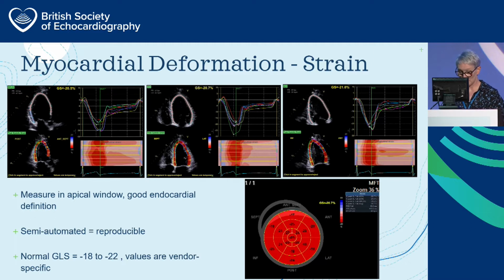So in clinical practice, we measure global longitudinal strain, and we do that using speckle tracking. So the software on our machines chooses some speckles in the myocardium and basically tracks them all the way through the cardiac cycle and determines basically the percentage change in length as they do that. We obtain our average peak global longitudinal strain using apical long axis view, apical 4-chamber and apical 2-chamber views, which you can see on the slides there.